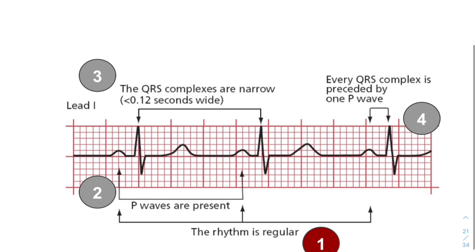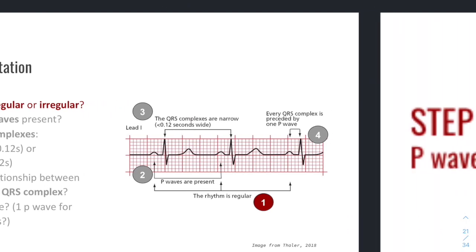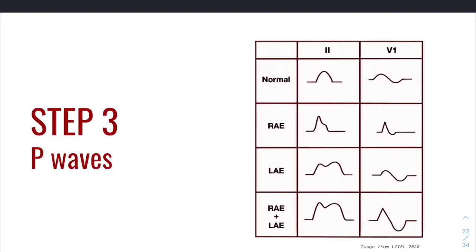And I'll just show you here: is the distance between this and this the same as the distance between the next peaks? You can see it's pretty close, but we'll see on some practice ECGs that you're going to either get that consistently, and that's how you know that the rhythm is regular, or if it's inconsistent, or it feels random, then you're dealing with an irregular rhythm, and that's also going to help you determine which of the rate methods to use.